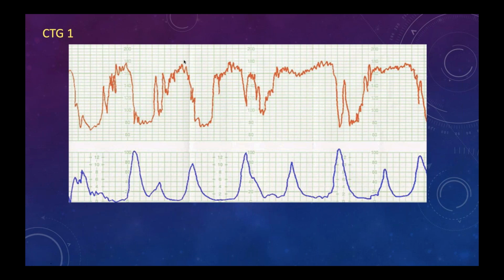Okay. This is a CTG which is showing the baseline of around 140 to 170. Only one person will do it, otherwise they will be confused. I have got many traces, so I will be able to give chances.